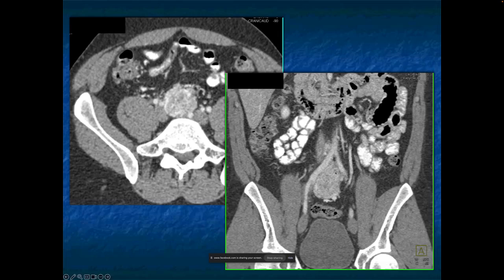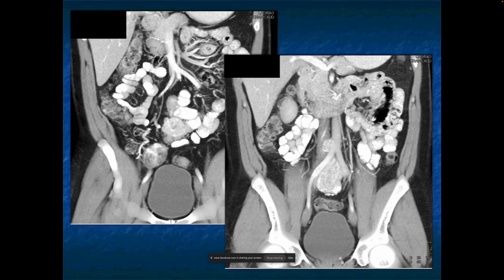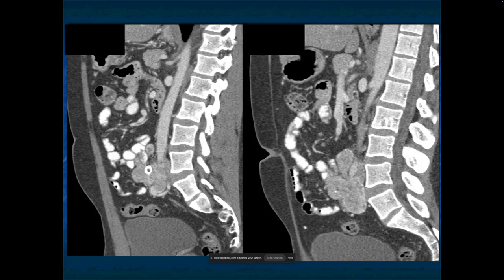There's this relationship to the iliac vessels. Just a wonderful example, and there's actually several masses there, and the main mass. Vascular mass, organ of Zuckerkandl near aortic bifurcation, which was an ectopic pheochromocytoma or paraganglioma, depending how you want to call it.